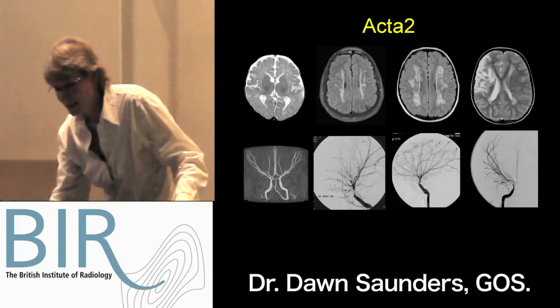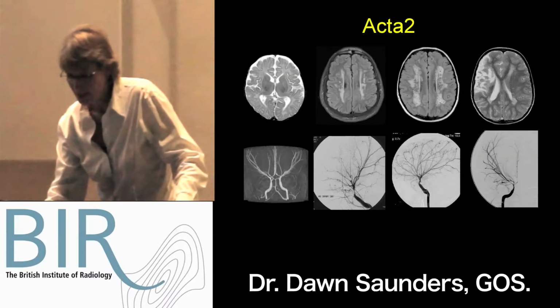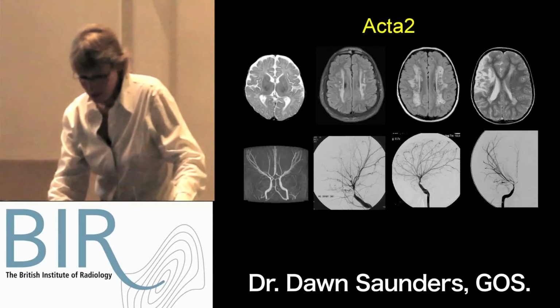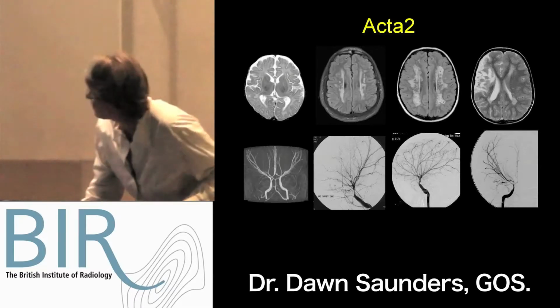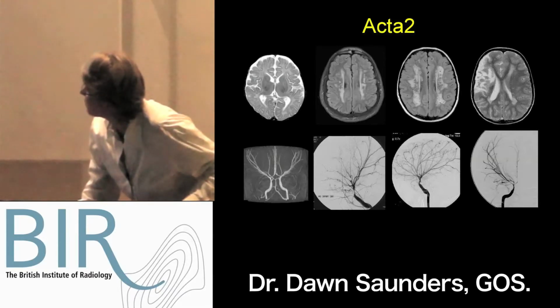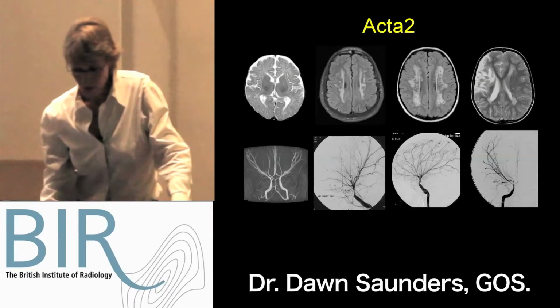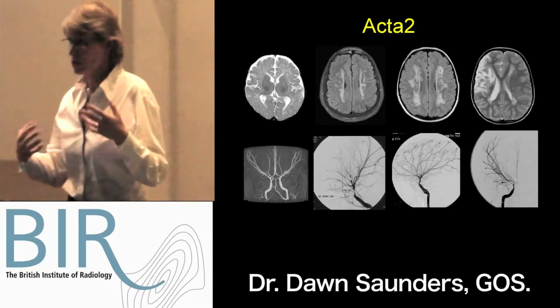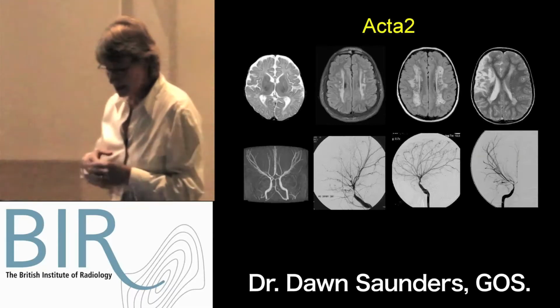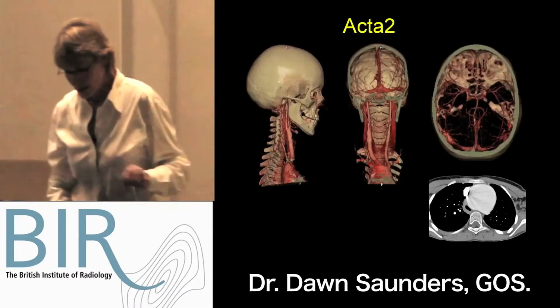So it's actually dilated more proximally, and then it tapers. And then you have these very attenuated and straight vessels. And more peripherally, again very difficult to demonstrate, but they have rather tortuous, very, very small vessels. As you can see, this child hasn't got any infarction and has a relatively benign course. We've got follow-up imaging 1 and 2 where we haven't seen any progression of the disease, but we don't know how long it progresses over or whether in fact it progresses.